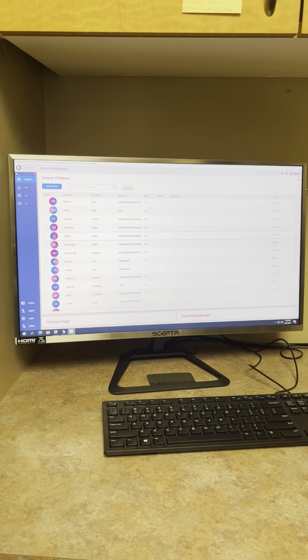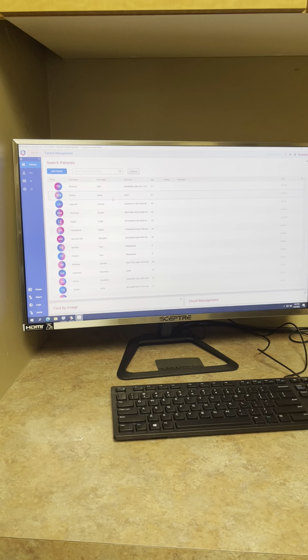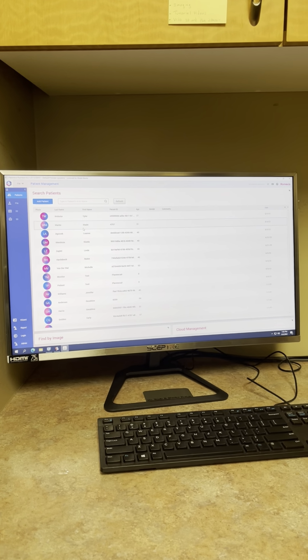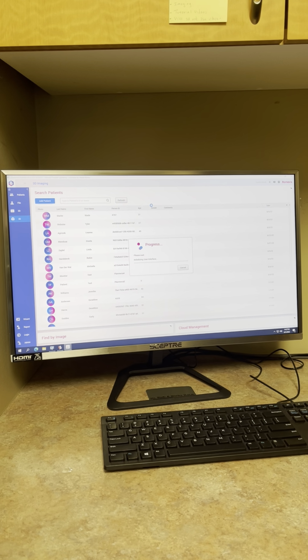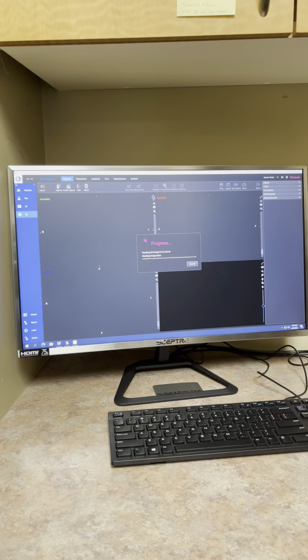Going to create the patient. Once you've captured an image on that patient, you never have to go back in through Dentrix again. If it creates the patient, it's there. So let's just say we already have the patient and we're going to take an image. If you go through Dentrix each time, does it keep creating patients? No. Okay.